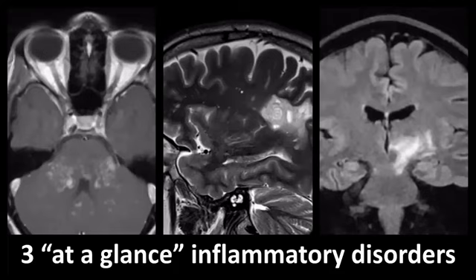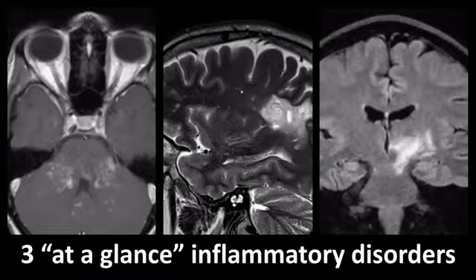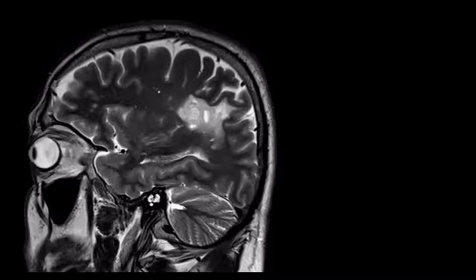Okay. Then let's move on to three Aunt Minnies. So three very typical patterns or signs that can lead you to the correct diagnosis provided you know them. And the entities are actually quite rare. And this is where I find these Aunt Minnies or these radiological signs very handy.